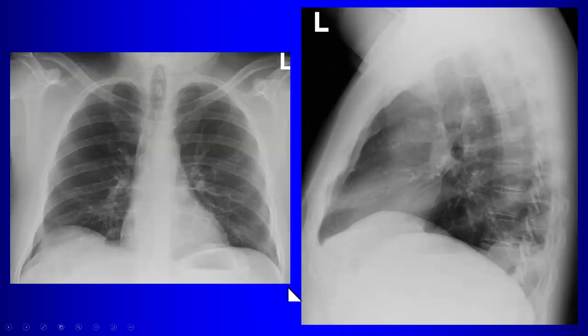And then what about this? What's abnormal here? Where's the abnormality? Do you see it on the lateral?